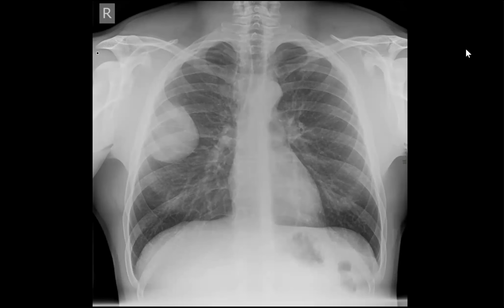I'm not able to visualize the medial aspect of this adjacent upper rib, but I am suspecting some involvement of it, and there is no definite evidence of any erosion of the lateral chest wall bony margin, and no definite soft tissue extension. But anyway, because of the dense bone, I'm not able to see any soft tissue component.